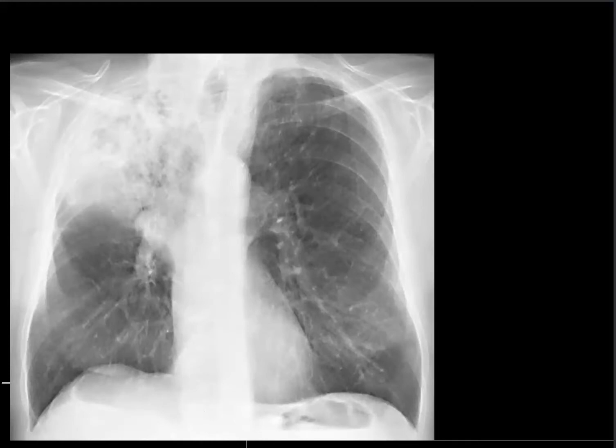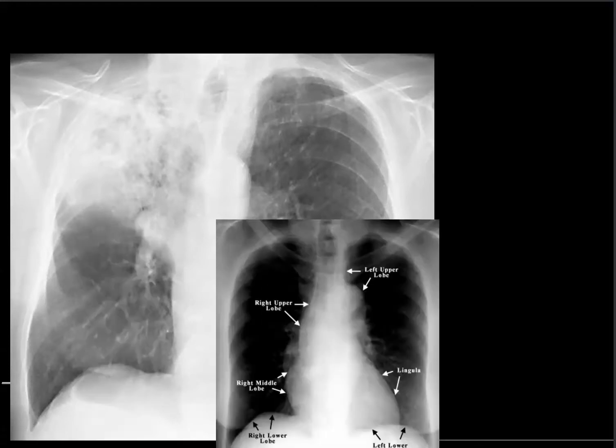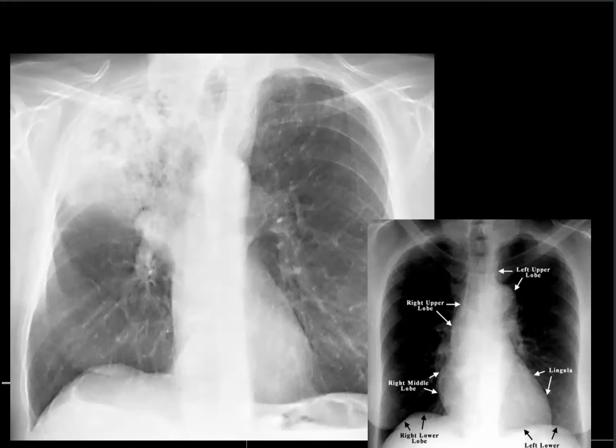Where is the pathology? Let's give you a little clue. Anyone? It's right upper lobe pneumonia. Okay?